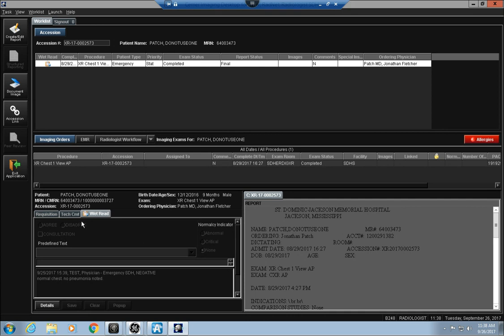By agreeing or disagreeing, this does produce documentation that is automatically sent to the ER, someone in the ER who will be managing this list just like they do now, and they'll have a chance to act upon this and get with the patients as well.